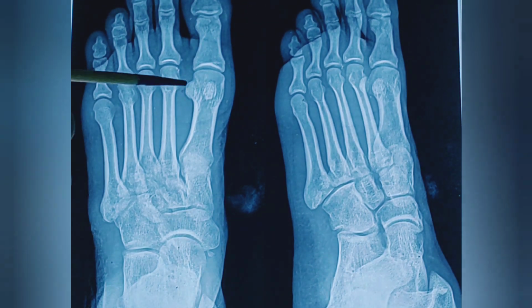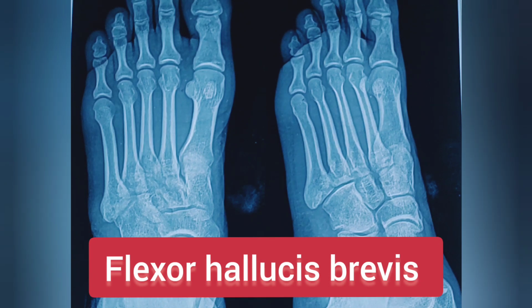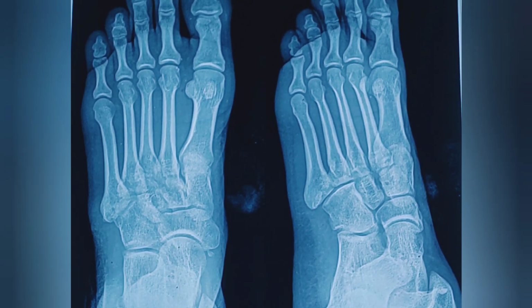But sometimes these two sesamoid bones may be absent congenitally, but if present, they are under flexor hallucis brevis. Sesamoid bones may also be found in the tendon of tibialis posterior, may be found in the tendon of tibialis anterior, and may be found within the tendon of peroneus longus, which is called the os peroneum.